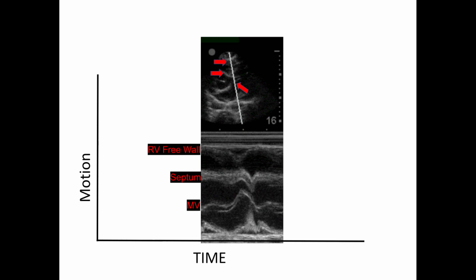Yeah, I think that was the whole thing. So once you play around with those modes, with M mode and B mode, and try using different presets, seeing how it affects the image, practice switching probes, practice adjusting the depth, see what happens when you change the gain, mess with those dials for the time gain compensation, and then when you're ready to move on as a group, you can go to the next lecture.